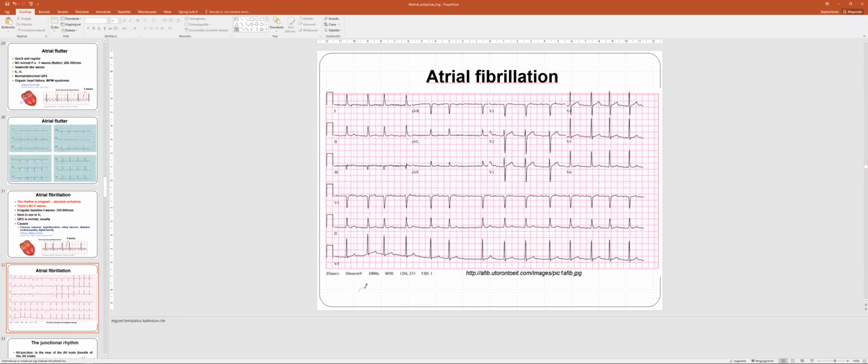That's a P wave, okay? That's a P wave, that's a QRS, and that's a T wave. When you have noise, what will happen? You have a noisy background, a noisy P wave, a QRS complex, and a noisy T wave, yes? This is the noise. However, when you have atrial fibrillation, there is no P wave. You don't see this P wave. You only have a fibrillatory wave, okay? This is how you can distinguish.